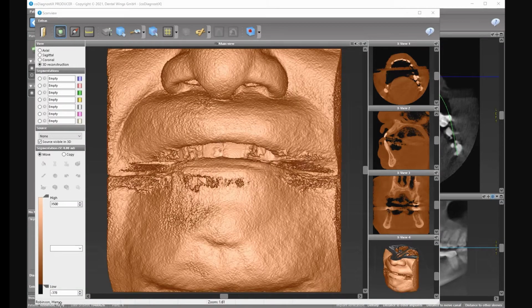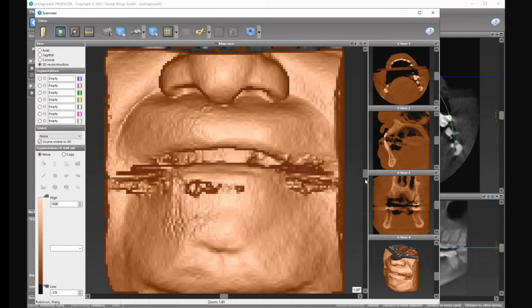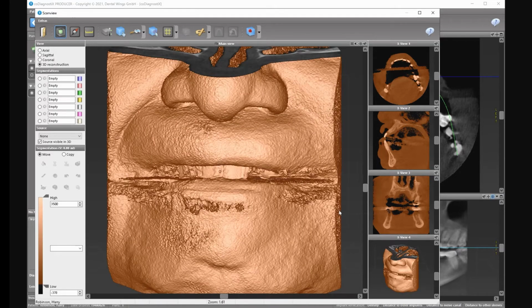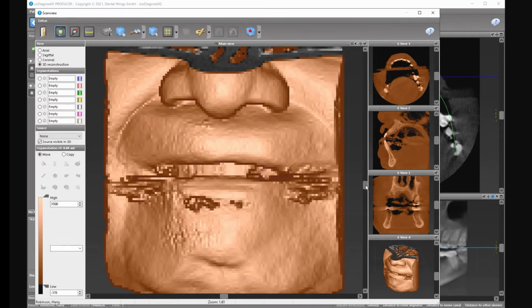Okay, so now we get this image, and again, you can see here when it was taken with the head up. So that might be a little bit of a problem. See, this is what it should be. This is what we'll see later on. We can fix it in the coordinate. More important for bigger cases than a small case.